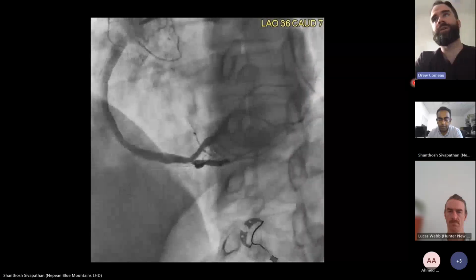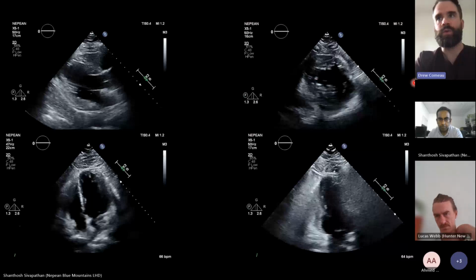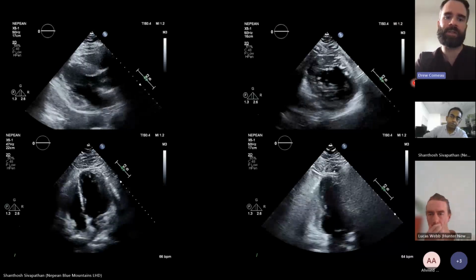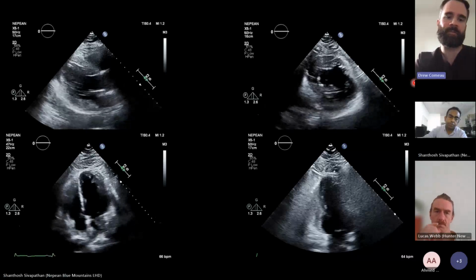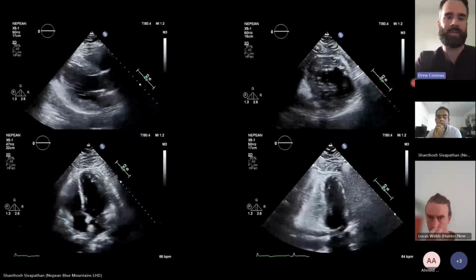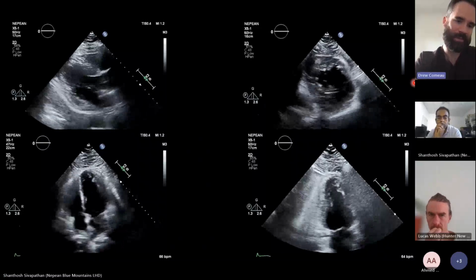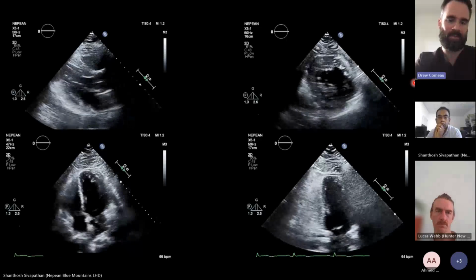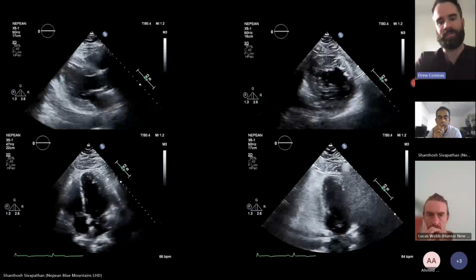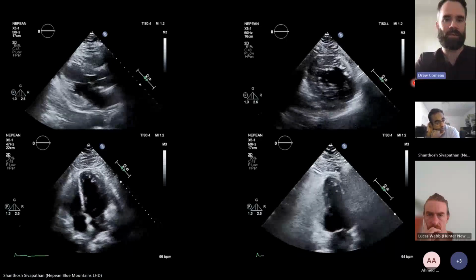From acknowledging the anatomical variability with the coronary territories, would you put a lot more emphasis on the right ventricle and its function? If you see inferior regional wall motion abnormalities, and if the RV is reduced, like maybe on second glance the RV is impaired in that inferior view, then maybe you're more inclined to say the RCA. Whereas if it's preserved, then you're leaning more towards circumflex.